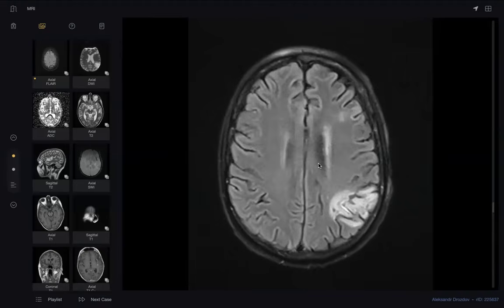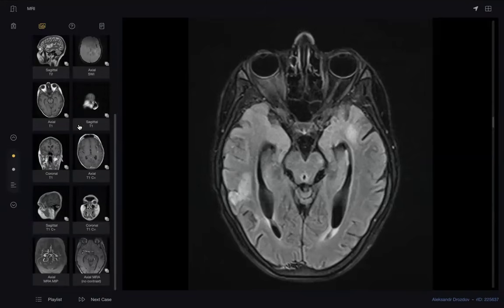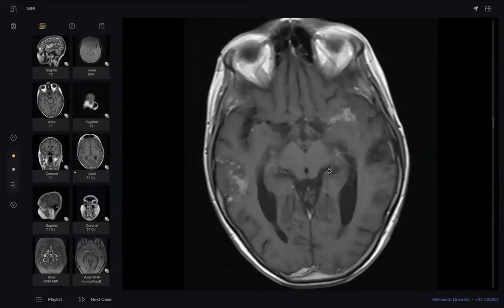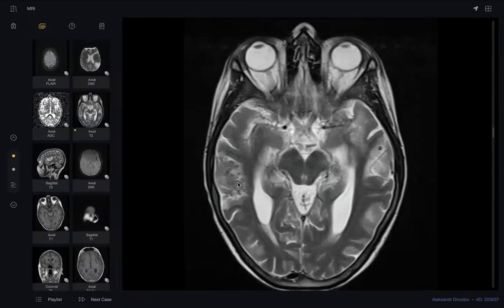Even if you insist on talking about thromboembolic disease, vasculitis is very important, especially if you go down, after I showed that this is nodular enhancement. See, not only nodular, there are ring enhancements, very characteristic of tuberculomas as well. If you concentrate on T2, do you think this is tuberculoma or abscesses? Very dark center. This is tuberculomas.